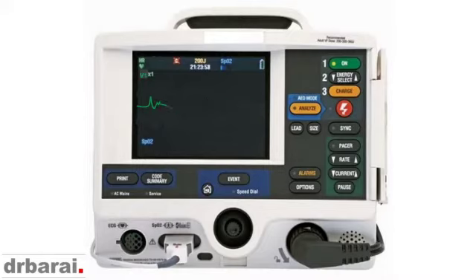This is another interesting case, very rare, but this can happen. This is a young patient from Vietnam who was brought into the emergency department with a history of collapse. And this is what we found in the initial cardiac rhythm in the defibrillator machine. If you carefully look at it, there is a P wave followed by a QRS complex, and then there is an ST segment, and then there is an inverted T wave here.